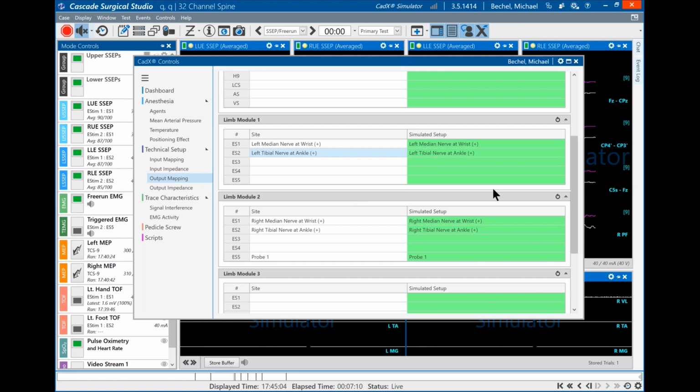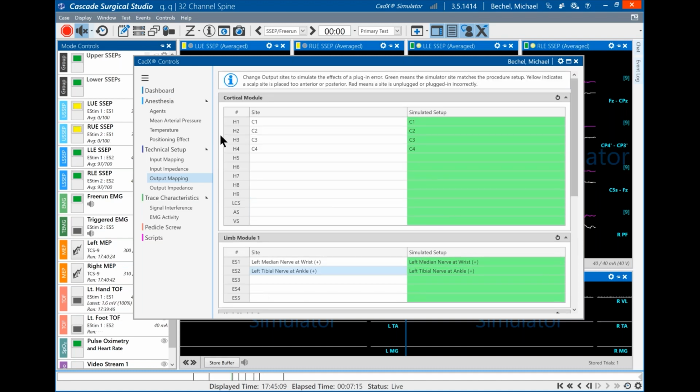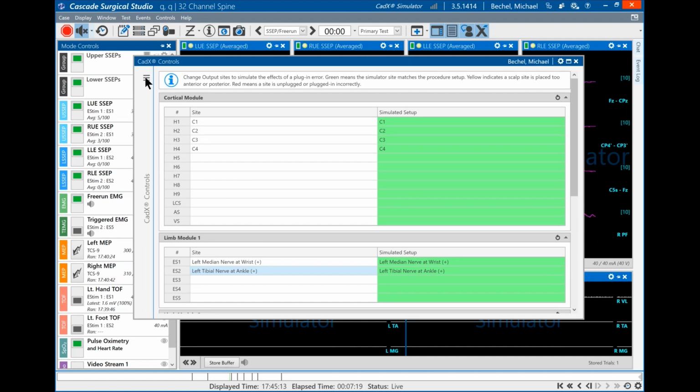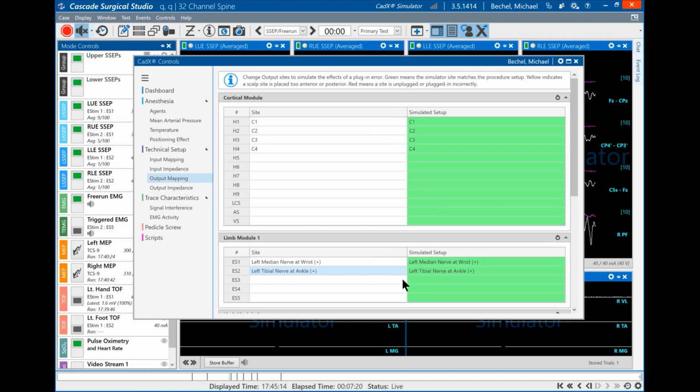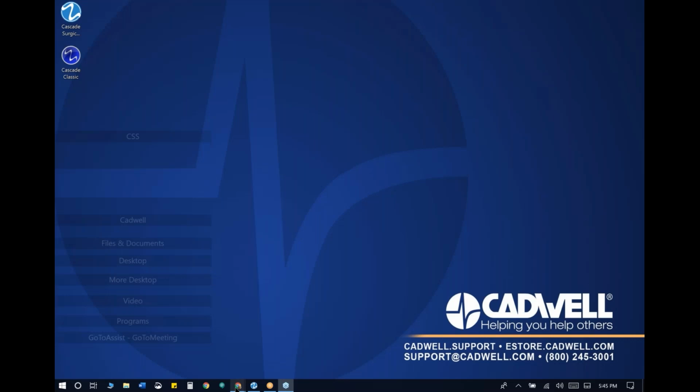And then there's actually an assessment mode that will allow you to check off whether these various scenarios were adequately or accurately identified by the person you're assessing. Now, I'm sure the question is, how do I do that? So let me show you the best way to get this information.